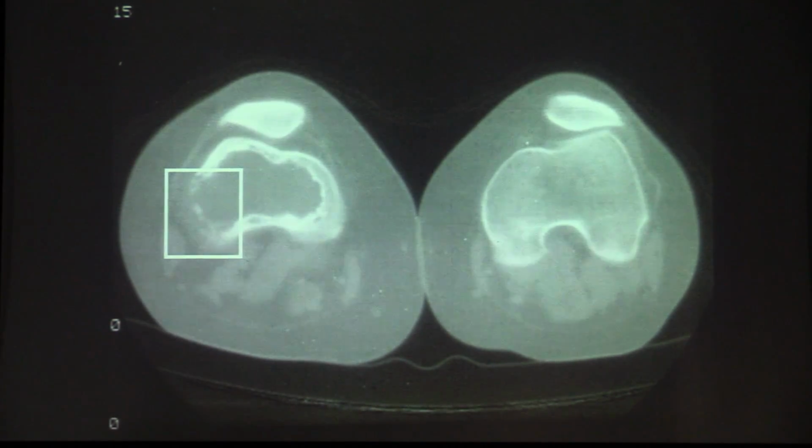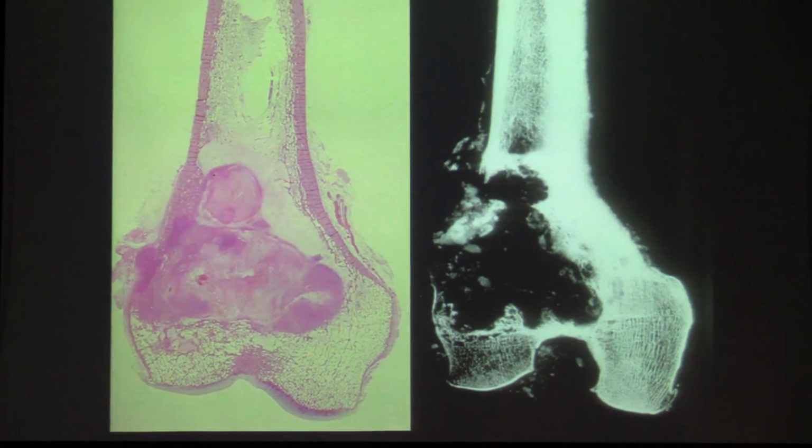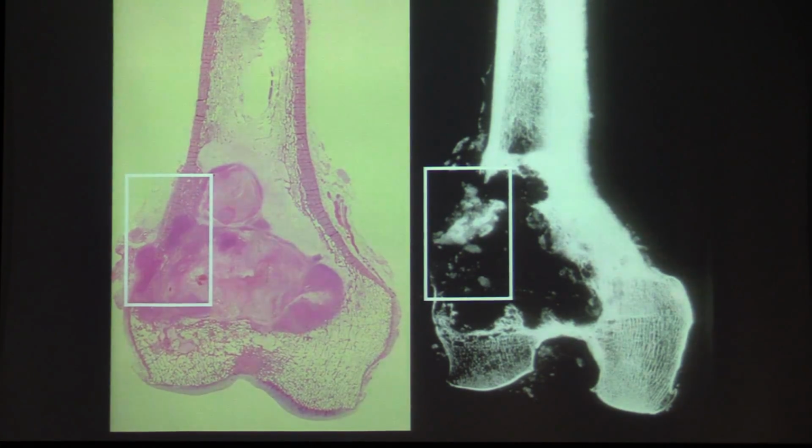And this is an important concept because as radiologists, when we're asked to biopsy this, we have to biopsy that area of the greatest biological behavior. So it tells you not only that the behavior is changing, but it tells you where to biopsy. And this was a high-grade malignant fibrous histiocytoma arising in a previous benign fibro-osseous lesion, likely an intraosseous lipoma with involutional change. And this was a really nice example of such a lesion seen at the AFIP, where you can see that sclerosis, the very destructive changes, and the corresponding macroscopic section, again showing that high-grade sarcoma arising probably in that ischemic bone that forms at the margin of the lesion.